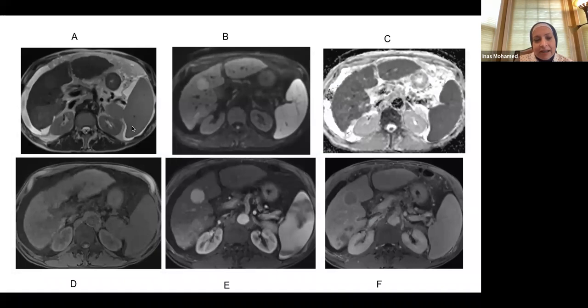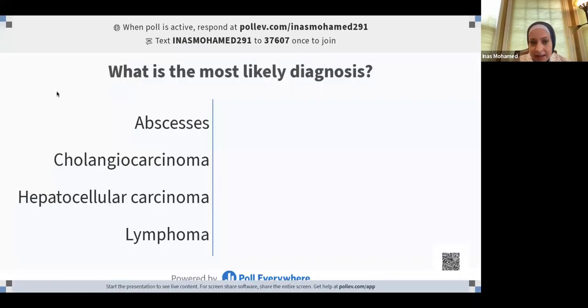Okay, and quite frankly, whether you're looking at MRI or ultrasound, anything in a cirrhotic liver is HCC until proven otherwise. Because what happens is, as the liver shrinks with cirrhosis, it loses its beautiful cysts and hemangiomas and all that stuff. Again, anything in a cirrhotic liver, you have to put in your mind reading ultrasound. It looks hypoechoic on ultrasound, it looks hyperechoic on ultrasound, it looks iso. Anything is HCC until proven otherwise. You have to put it in the back of your mind. And we're going to talk about the LIRADS in a second here. Okay. So yes, this is of course HCC, right?